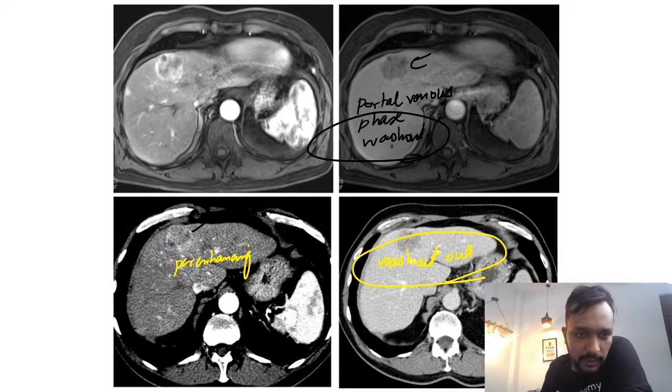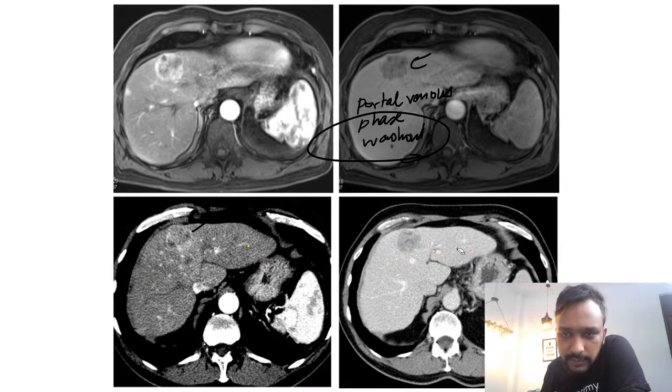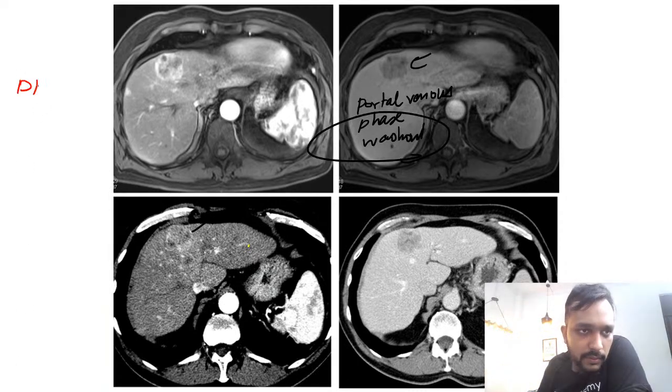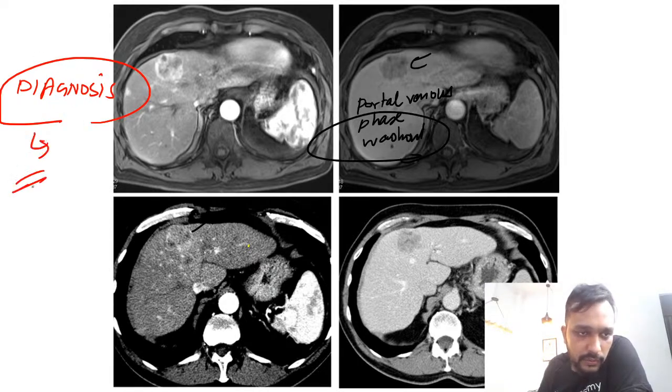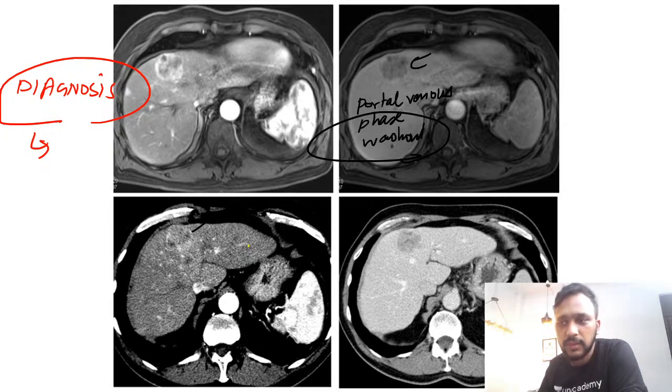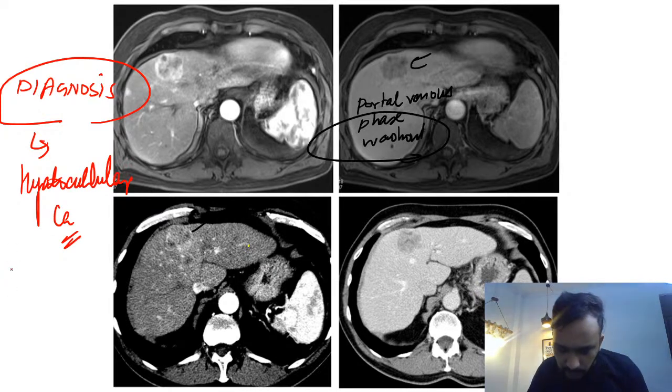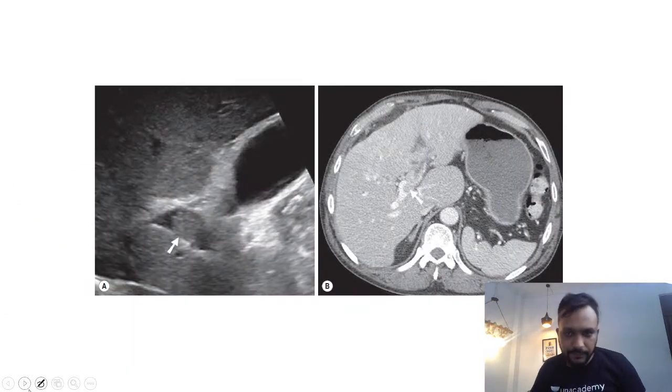So, guys, now can you tell me what is the case? What is your diagnosis for this case that we are seeing here? Anyone? So, guys, this is a case of hepatocellular carcinoma. Is that right?